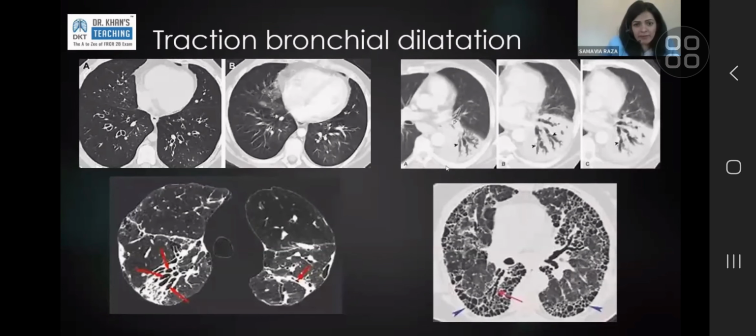Neda has said air bronchogram in concept of consolidation, and that's absolutely right. This is consolidation. So this is the point I was trying to make. Sometimes you can see dilated bronchi in consolidation as well, and that presence of air bronchogram can immediately make you think, is this bronchus dilated or is this ILD? This appearance is a bit more prominent than you would see in normal consolidation.